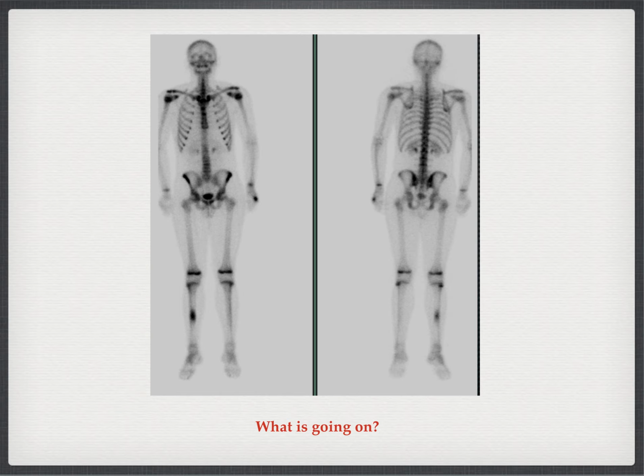What's going on in this case? Well, this is something we generally don't want to see. This is a child, as evidenced by markedly increased uptake in the growth plates, which is where the new bone is forming.